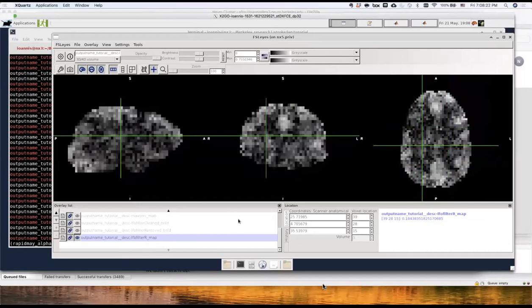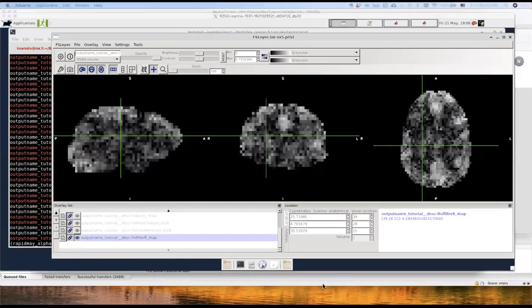So I've shown you a bunch of files, starting from the lag map, the correlation map, the actual clean data, what was removed from the data, and how the GLM performed in each voxel. All of these overall will give you an idea as to where the LFO signal lives in your brain, and eventually how to remove this from your data.